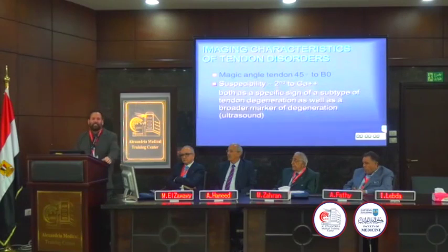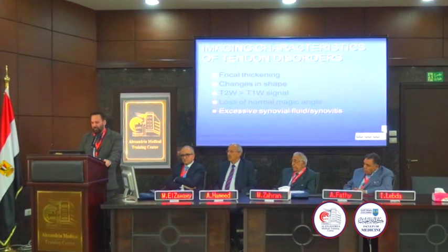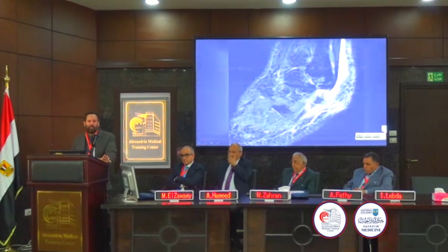The next thing you can see is susceptibility artifact. So here's a big calcified deposit in the Achilles tendon, and that's a specific type of tendinopathy that we will get to in a minute. And then excessive fluid, and here's peroneal synovitis. And again, normal fluid is basically a milliliter. Little bit of fluid. Anything more than barely perceptible is probably abnormal.